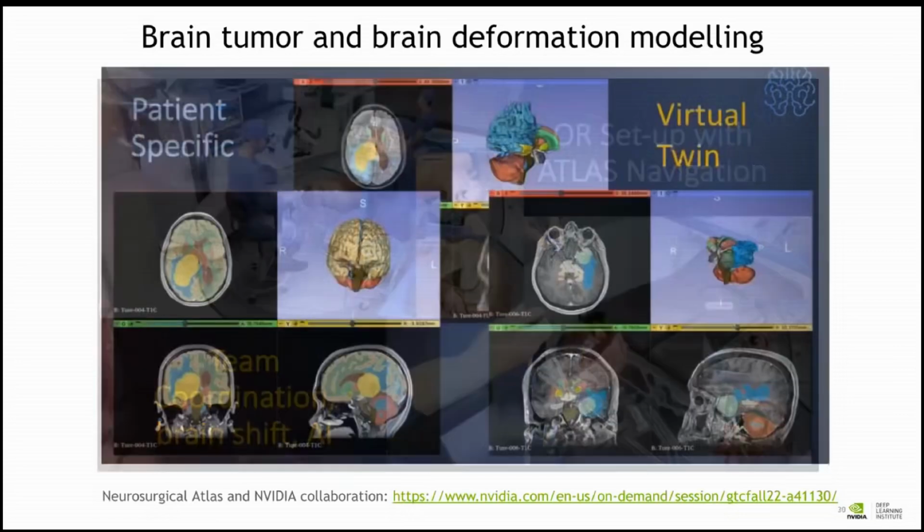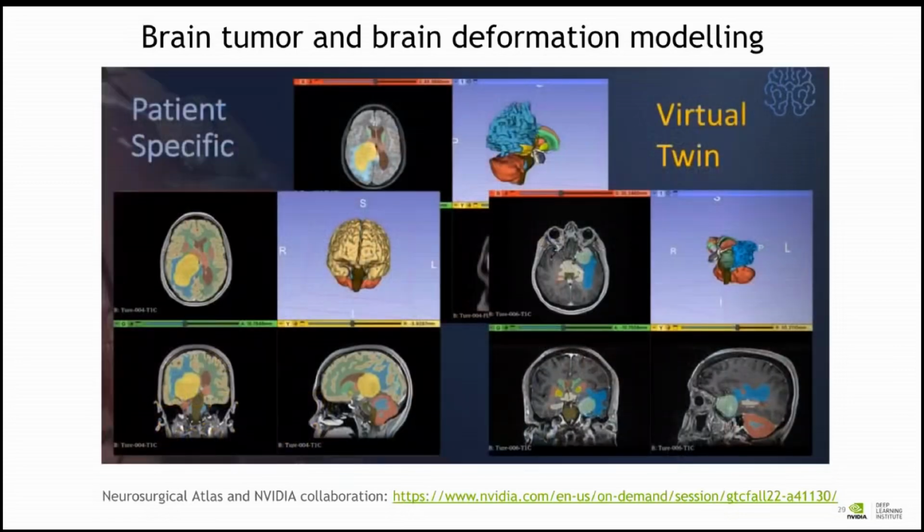Yeah. We did that essentially. In this project we used 4 MR modalities or MR sequences, and for that we had to register the modalities and then train the model with multi-modality inputs or multi-sequence inputs. There's a way to register multiple scans. Yes. You see a simplified version of the model here, only segmenting the regions, the anatomy, but we also segment the vasculature, the veins and arteries. You don't see the veins in all sequences. You have to use CTA or a specific sequence for veins and arteries. So we basically register all of them. But yeah, you can do that as well.